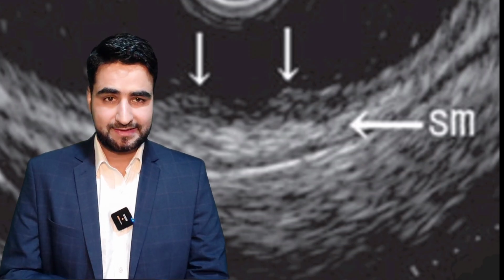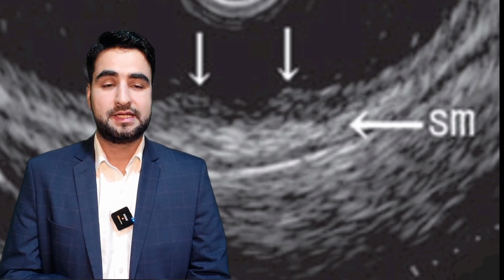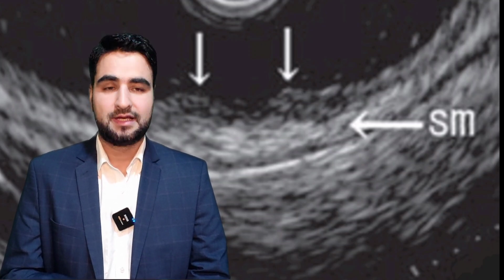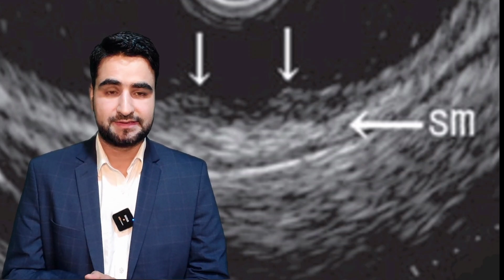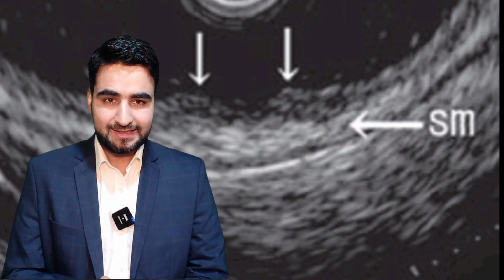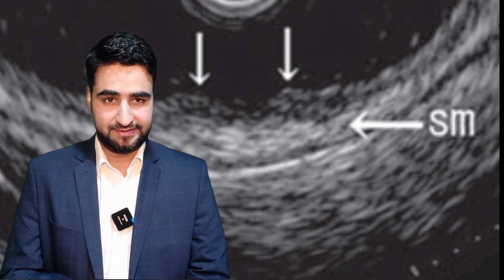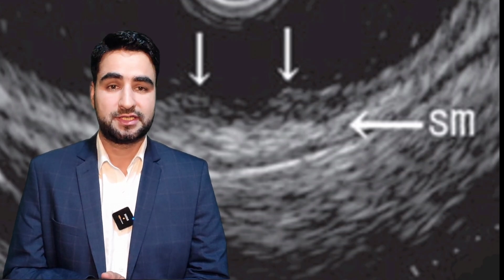In early gastric cancer, for example, the disappearance of the first hyperechoic layer reflects tumor infiltration replacing the epithelial surface, while preservation of deeper layers suggests T1a stage, that's limited to mucosa. In benign erosions or ulcerations, inflammatory change can cause similar findings but without irregular margins or deep hypoechoic invasion.